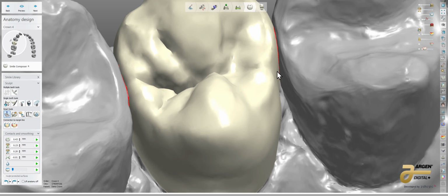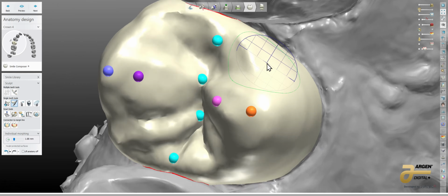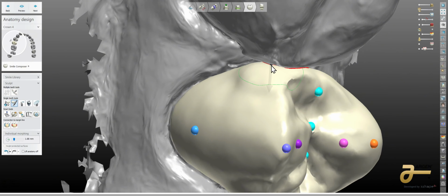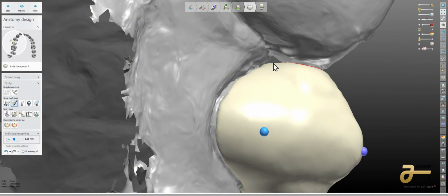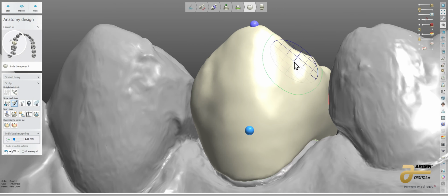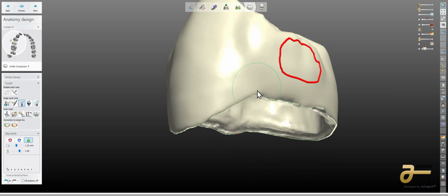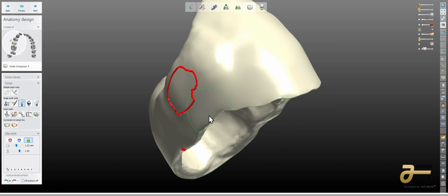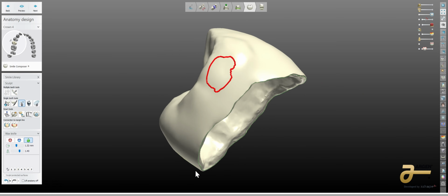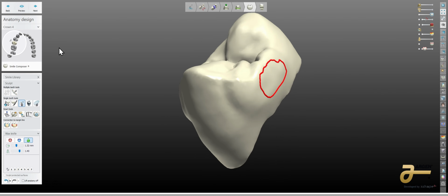So what I'm going to do with this tweezer tool, my favorite tool inside of 3Shape, is pull it up here and pull it down here just a little bit. Okay, I want this contact to be rounded. I want it to emerge. I want this papilla to have space. I don't want to choke it off. So real quickly, before I even work the contacts, I'm going to come down to this margin line and just smooth this, so it's the nicest transition back to the margin that we've chosen. Okay, so now we have contacts here.